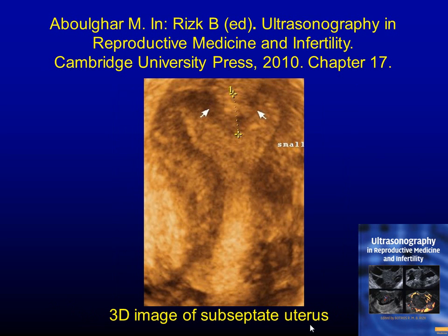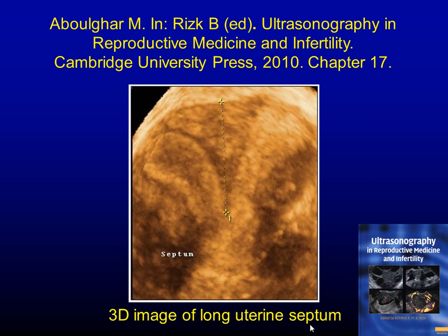Again, here to show you where to put the crosses. So the crosses, you would like to think that they are at the midpoint of the line that joins the two cornua, but it's really above that. So keep that in mind, that that's above it. And that makes a very big difference in the reporting itself on the ultrasound.